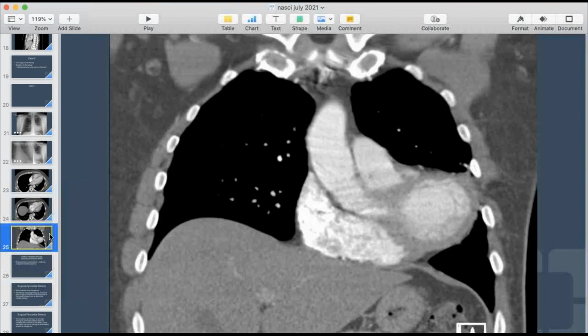I would say upturned cardiac apex, so possibly a tetralogy. That would be the first thing that comes to my mind. All right. Anybody else? It seems like herniation in the pericardium of the heart, it looks like.